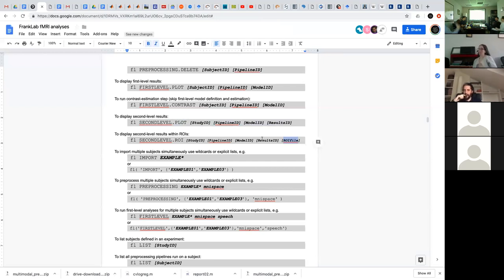The thing that we have to mentally get past for the cortical ROIs is, even if we say the ROI that we're using is this ROI label on the FreeSurfer FS average surface, that thing does get mapped to each brain individually, so that ROI won't be the same volume in each subject, it won't be the same surface area in each subject.